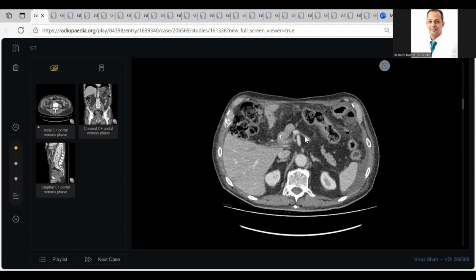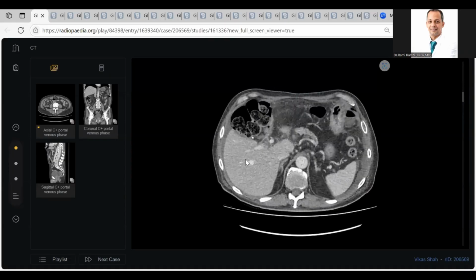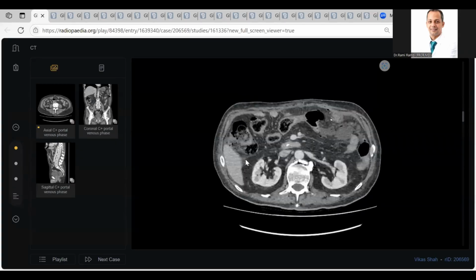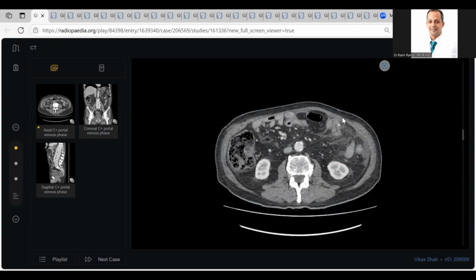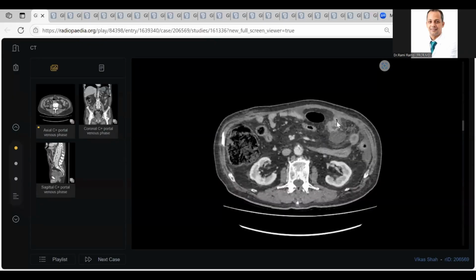I'm not sure which side you're looking at or want me to look at. This pre-splenic, pre-hepatic free fluid. So subcapsular free fluid. And you said there are surgical clips here. Correct. So connect the finding. Yes, I can see it now.